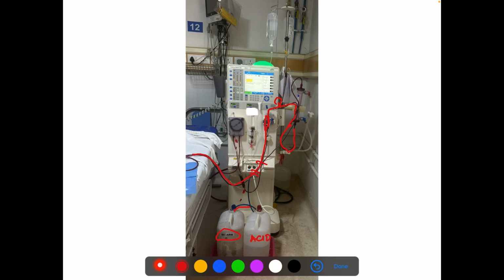machine. Here behind we see we have an RO water line. Okay, so this is our RO water line. So RO water comes from your supply, and this acid and bicarb, that is prepared solution by the technician generally, they three get admixed and a proper concentration of dialysate flow is prepared and is sent to the dialyzer through this pipe from the back side of the machine.